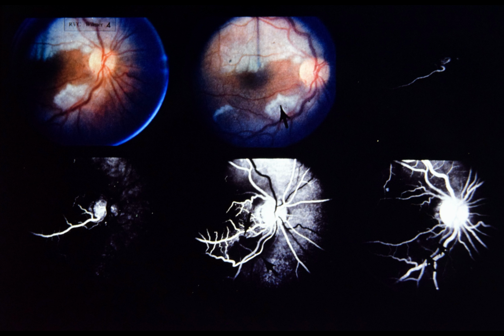Upper left and upper center, note appearance of optic disc and macula 5 days after acute central retinal artery occlusion. Note marked whitening of the retina above and below the papillomacular bundle. Upper right and lower left, 9 and 10 seconds after dye injection, respectively, note filling of cilio-retinal artery and no filling of main branches of central retinal artery. Lower center, note obstruction of background choroidal fluorescence above and below papillomacular bundle due to retinal edema.